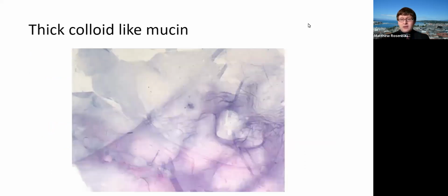So these cysts are tough. The problem is this is a cyst, unless you are lucky enough to actually get cells on it, so oftentimes you're just going to get this thick mucin. The term that Dr. Pittman sort of coined, I don't know if she coined it, but she certainly likes it, is thick colloid-like mucin. So it looks kind of like a thyroid biopsy. You will sometimes see cracking, but the point is you really want to see this thick mucin.